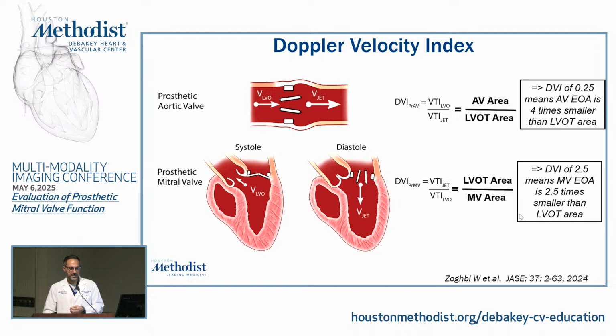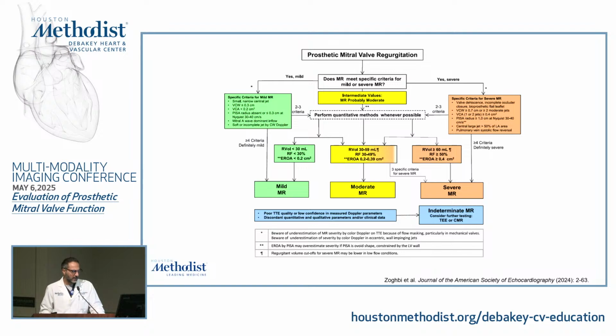And obviously, this is an effective area, because in the presence of mitral regurgitation, you will still have a high ratio, but not necessarily a small area. So that's why there's an effective component. I just put this slide there so we can clarify this concept once and for all. Obviously, beyond the spectral Doppler, we did the spectral Doppler, we have a suspicion.